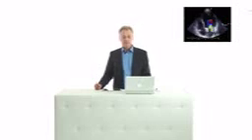This is the principle of the flow convergence zone, and this is what you should be looking at on the echocardiogram as well. The truth is that it is often easier to see the flow convergence zone than the jet itself, because especially if you image from a transthoracic approach, this flow convergence zone is closer to the transducer and before the mitral valve. Here is another very important part of the jet that I want to show you so that you can quantify regurgitation.